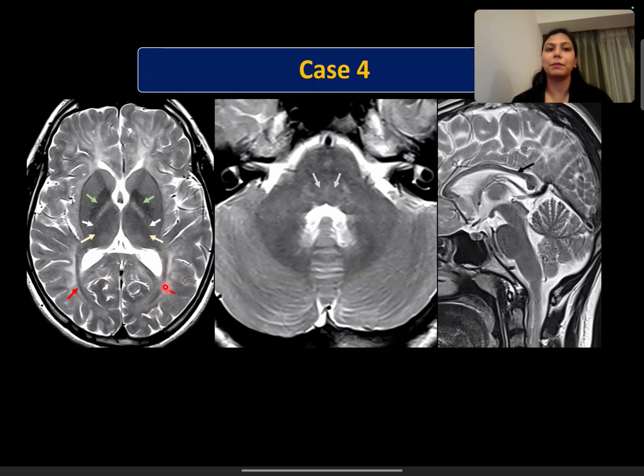This is not HEMS, because we are seeing diffuse hypomyelination, not only posterior brainstem involvement, but diffuse involvement with sparing of certain structures. HEMS rather involves only the early myelinating structures. Maybe seeing the dorsal brainstem, you thought of that. But what else can it be? There is sparing of the optic radiation. There is also sparing of the pyramidal tract in the internal capsule. Apart from that, there is sparing of the medial lemniscus, and there is associated globus pallidus hypointensity, hypointense thalami, and corpus callosal atrophy.